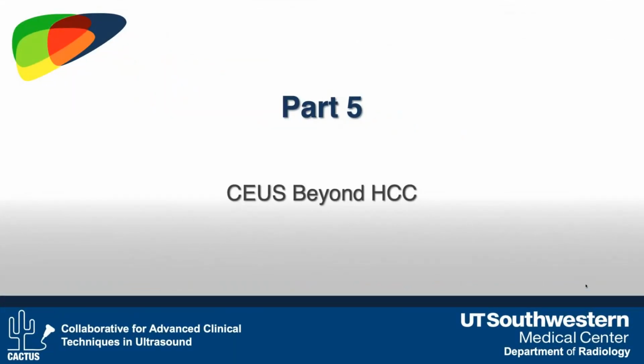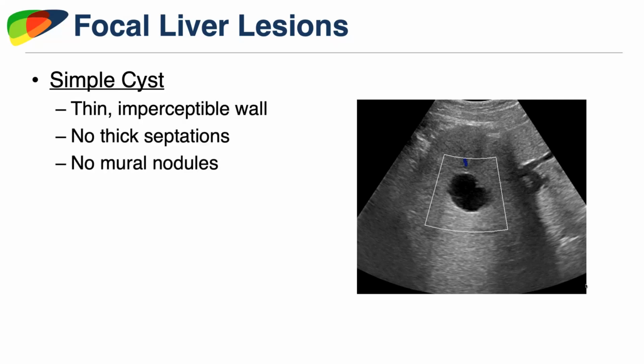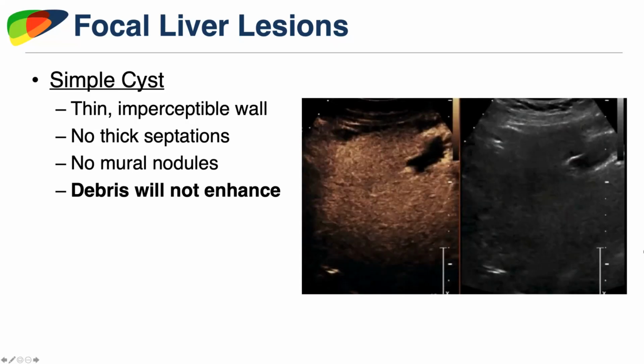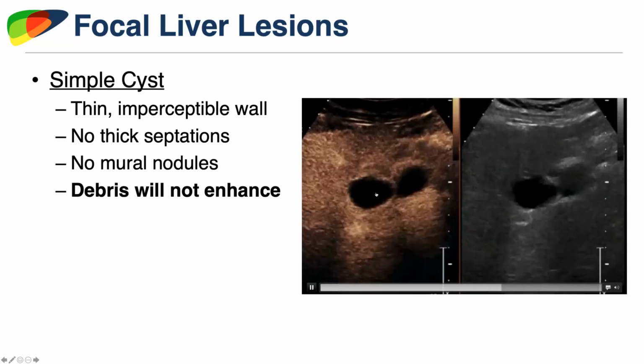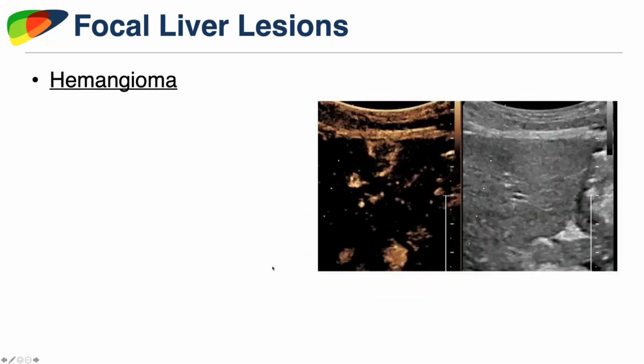All right, for my last couple of minutes, I just want to highlight some uses of contrast enhanced ultrasound beyond HCC. So obviously, a simple cyst is a simple cyst is a simple cyst. So what's nice is that debris or infiltrated material will not enhance. Thin septation may show a little bit of enhancement, but shouldn't dissuade you from definitively characterizing this as a simple cyst.